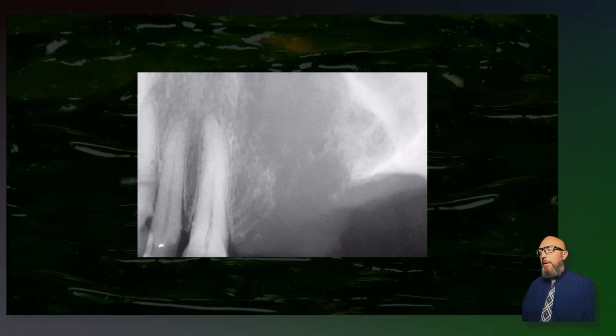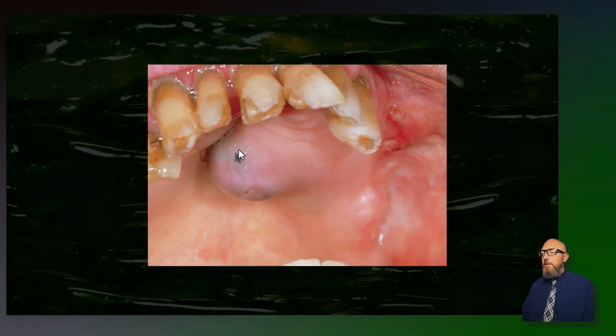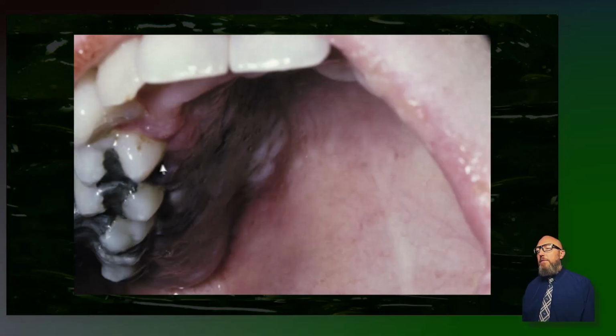That ill-defined maxillary radiolucency. So a reminder that a sinus malignancy can first denounce itself through the mouth. This was a carcinoma that arose in the sinus, then eroded through the alveolar bone and into the hard palate as we saw there.